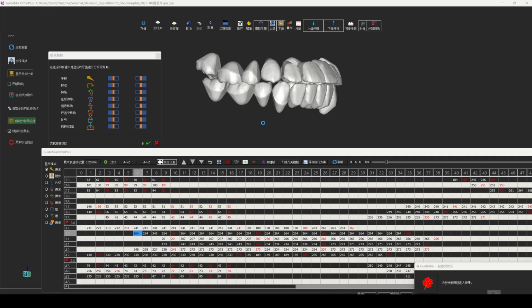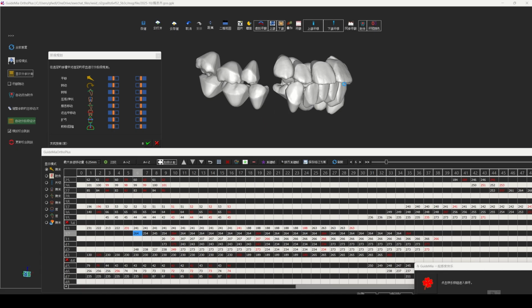That's why we said earlier in stage planning, we do a conceptual planning without worrying about the actual movement amount. And this is where we fix those amounts. So after this is done, you will see we make some adjustment to the movement amount and to the keyframes. If necessary, we could be adding steps.